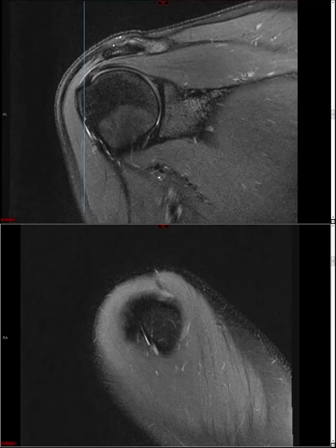And once again, as is a common theme in my discussions on MRI, it's important, at least when you're starting out, to always correlate what you're seeing on one sequence with another sequence to ensure that you're seeing things exactly the way they are, rather than misinterpreting something on the one sequence. Okay, so let's say it's all fluid signal here in supraspinatus. Then we should immediately go to the coronal sequence, and we should ask ourselves, at that specific location, what is the status of the articular surface fibers, okay?